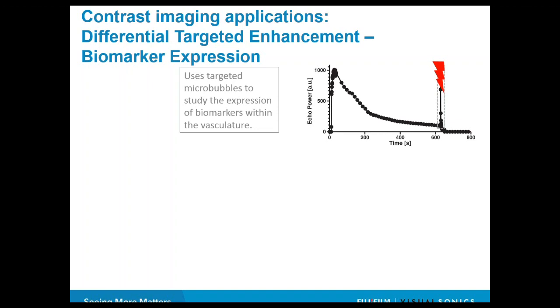So you would inject the contrast agent, you have a wash in, you have a wash out, and then later on, you see that there's some signal quite stable. It stays in this case, in this graph, for a couple of minutes. And then what's interesting for us, what we want to know is really happening right here at the end. So let me explain the workflow.